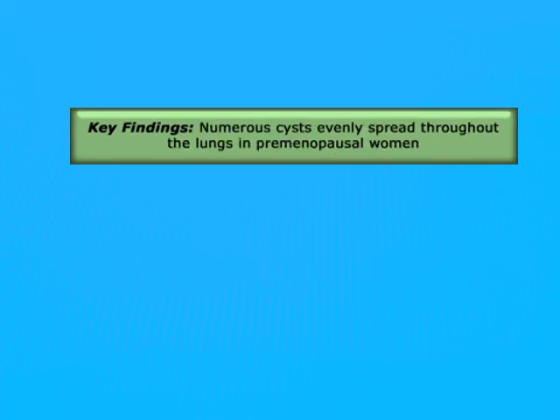Numerous cysts all over the lung in a premenopausal woman or in a patient with tuberous sclerosis: LAM.